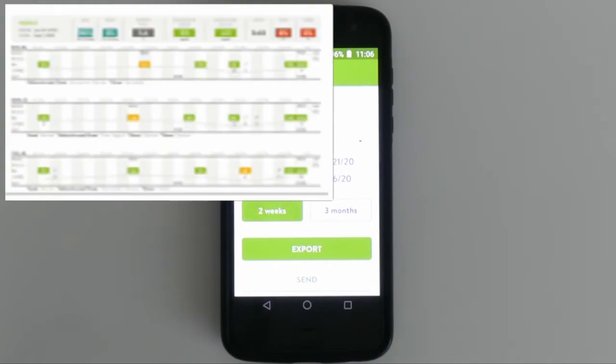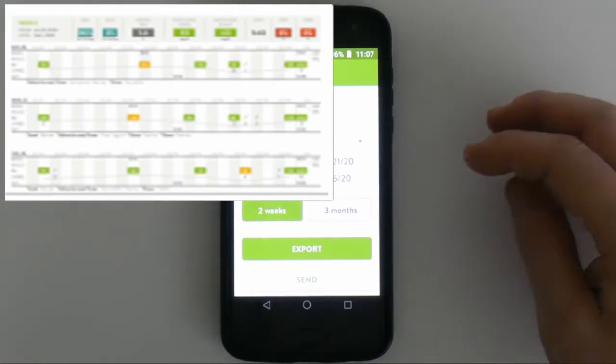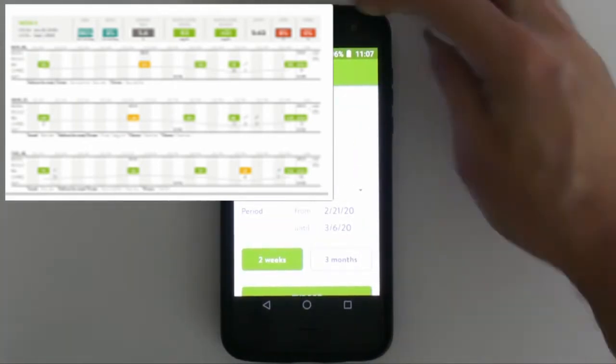Every week you'll see with this episode, I'll post an example of what those reports look like. They're pretty cool. I like them, and my doctor likes those.